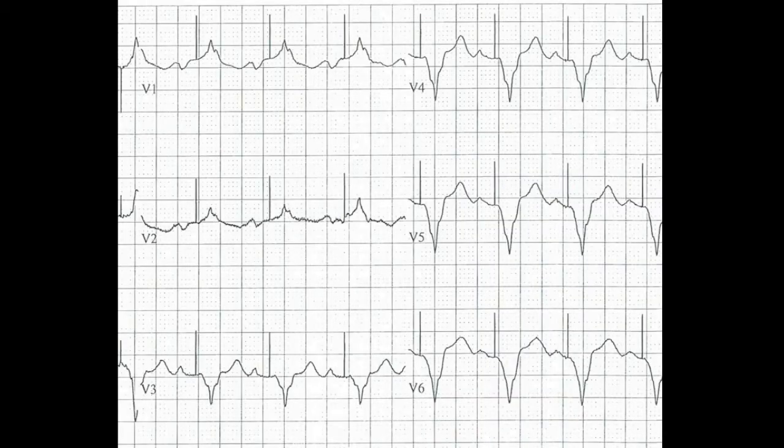Now, I am the first to admit that interpreting a 12 lead is as much an art as it is a science. Others like to remind us every 3 cardiologists will have 5 opinions on an EKG. And so some people are probably looking at my interpretation here of this beat, and in particular at my calling that the J point, and saying, hold on here, Todd, I have seen plenty of QRS complexes with right bundle branches that look like this.